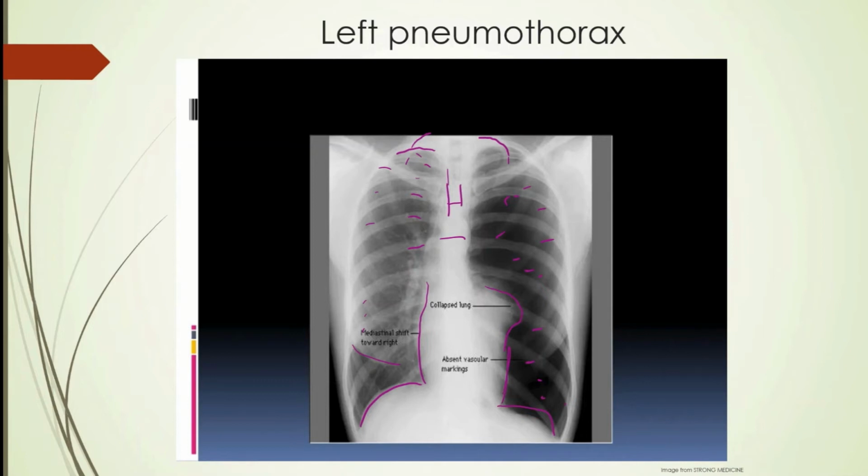So you can see if you do the method, I mean, this here obviously just jumps out at you. But again, many pneumothoraxes are much more difficult to pick out. And when you see one thing, human nature, you tend to forget everything else, and you might miss the second or third thing that might be going on.